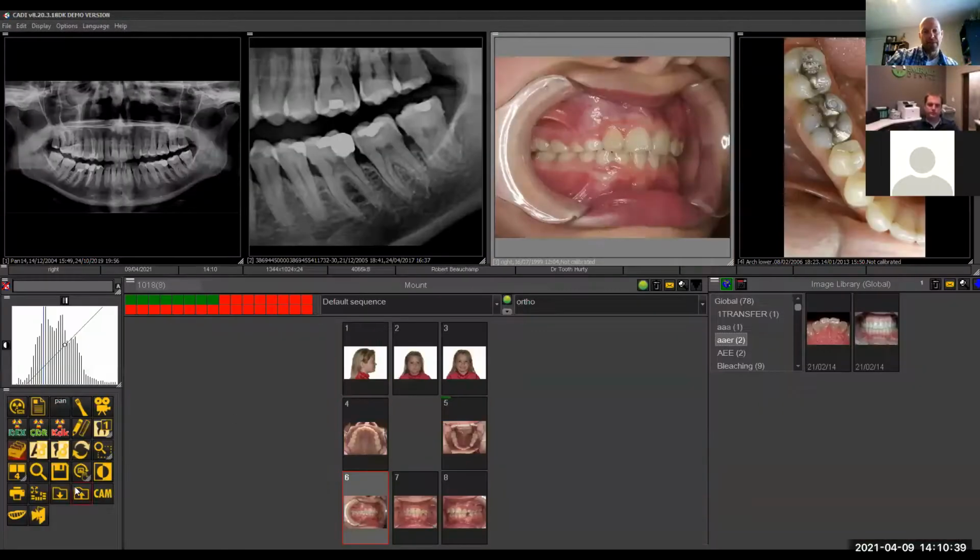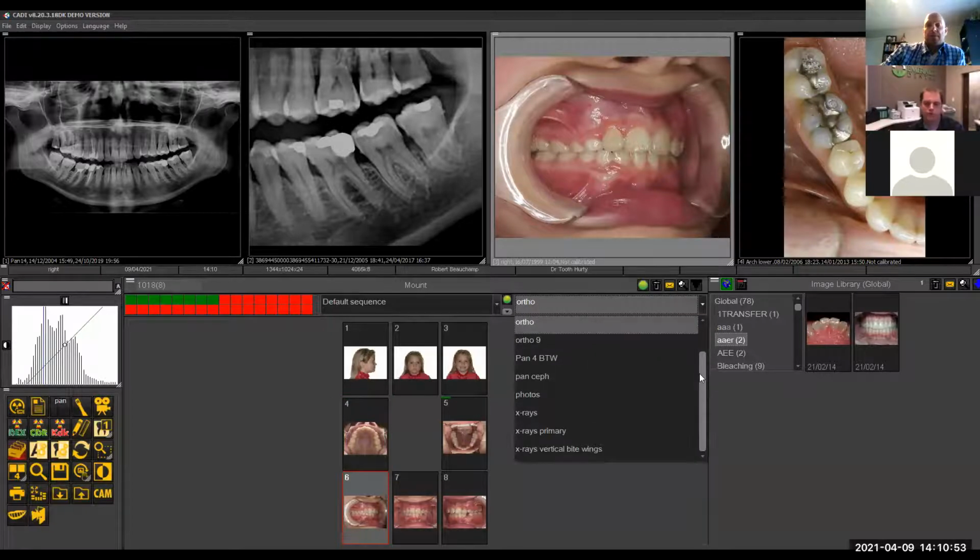So that's a feature too, a button that we have there. And that's pretty much it. I mean, there's a little bit more, but not much. That's the majority of the options and tools. So you had other questions? Yeah, a couple of questions. I hope I won't overwhelm you there.